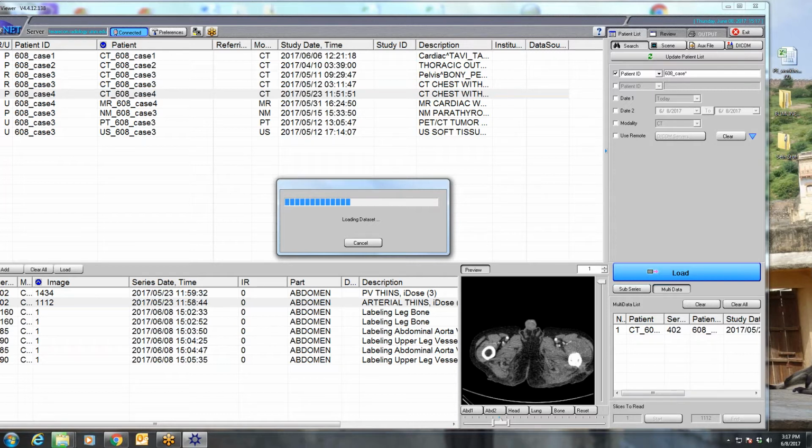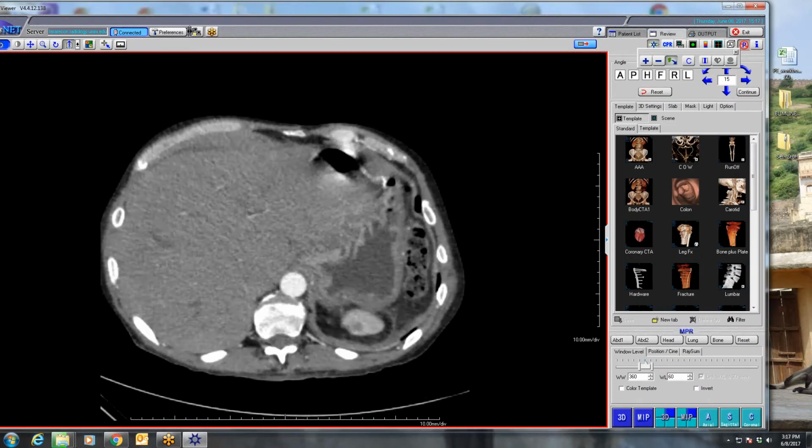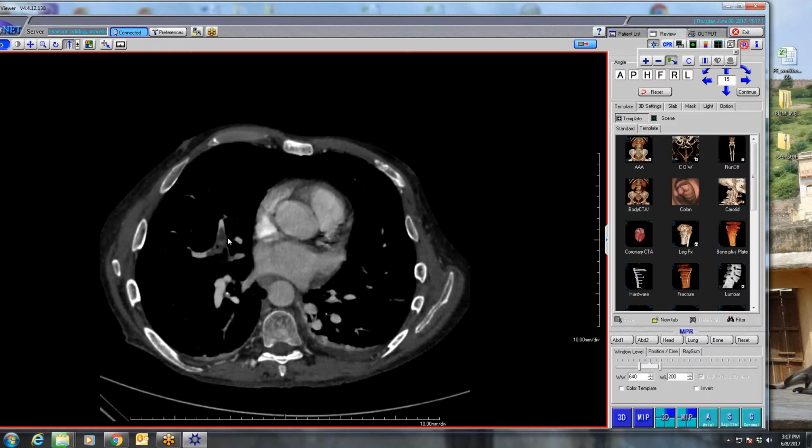He also has a pulmonary embolus, which is interesting, and I'll show you why, because the pulmonary embolus, which you can see basically on the first image, also has air in it from this infected thrombus. We called up the team because we were like, this guy's got vegetation. He's embolizing his vegetation. His vegetation has air in it, or his pulmonary emboli and vegetation have air in it.